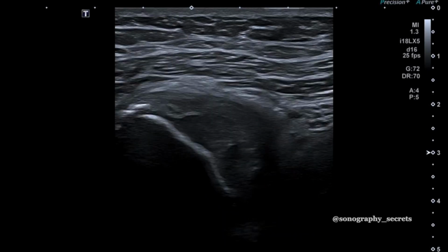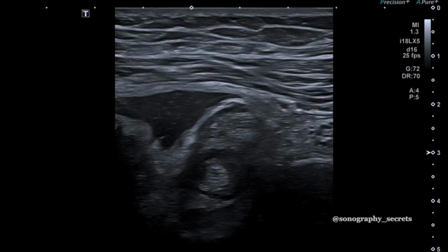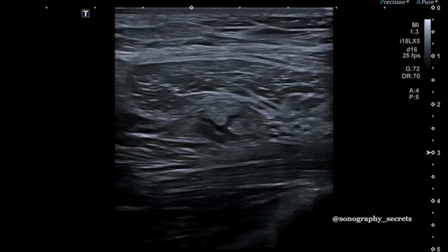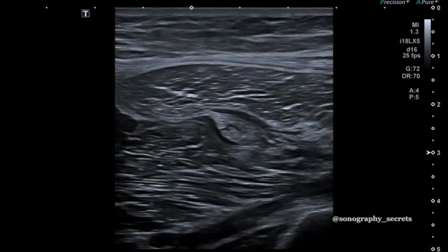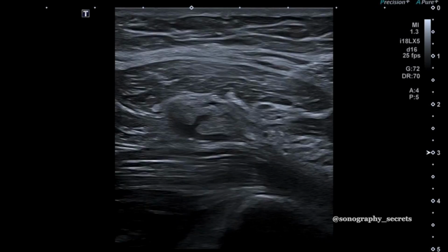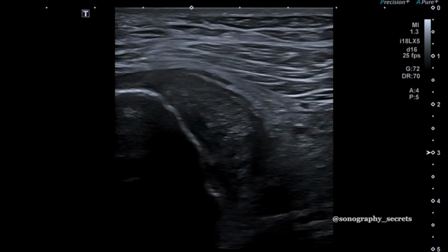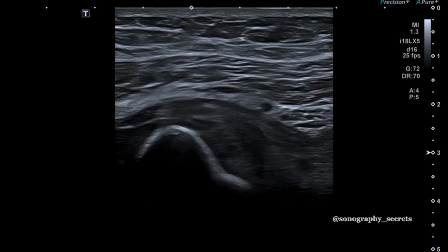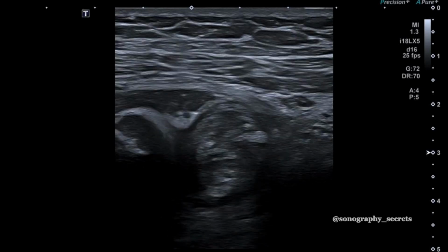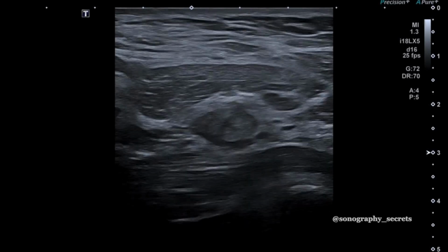So typically the hamstring origin tendinopathy will occur in runners, and often you'll see a bit of irregularity of the ischial tuberosity as well. So sometimes being able to identify that cortical irregularity of that ischial tuberosity will help you to indicate that there's a bit of hamstring origin tendinosis. Not too difficult in this case. It's quite severe tendinopathy, tendinosis with some high-grade tears through both the semimembranosus and conjoint tendon.